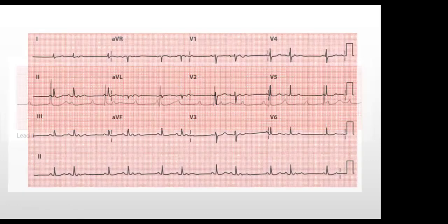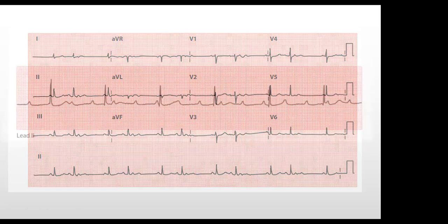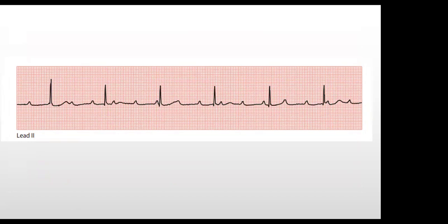Brilliant. So what do you think? Sorry, I'll take you back. My network cut me off totally here. But I thought it was a complete heart block, but I heard junctional escape rhythm somewhere. I don't know. So it's a complete heart block, meaning the AV node is blocked. So impulses from the upper part of the heart are not getting to the ventricles. But yet you can see ventricular activity, which is reflected in the QRS complex. So the question is, where is this QRS complex coming from?